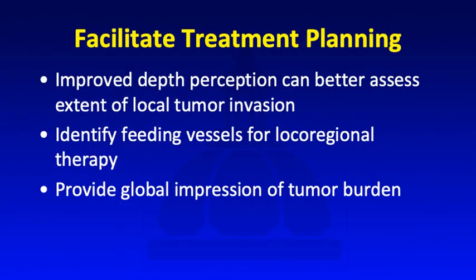And a great advantage of cinematic rendering is that it can facilitate treatment planning. The improved depth perception can better assess the extent of local tumor invasion. We can identify feeding vessels for local regional therapy, and also provide a global impression of tumor burden, which is helpful in communication with referring clinicians and patients.